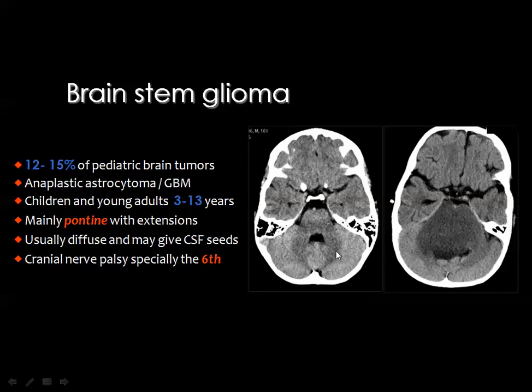And whenever the brainstem is infiltrated by the tumor, the brainstem is markedly enlarged, and you got flattening of the anterior aspect of the fourth ventricle, which is displaced posteriorly, and consequently you get supratentorial obstructive hydrocephalus. And one of the very important criteria of brainstem glioma is that it can have exophytic extensions. The tumor grows by exophytic extensions on both sides of the basilar artery.